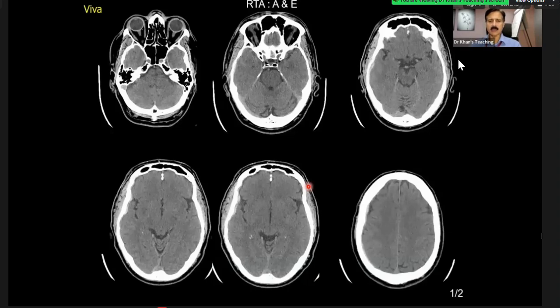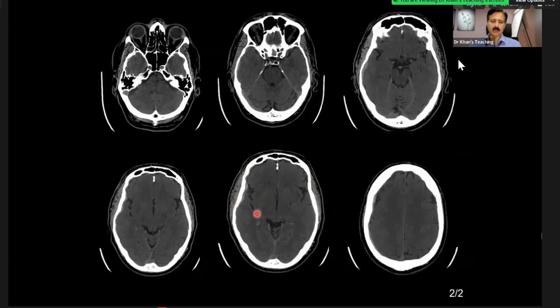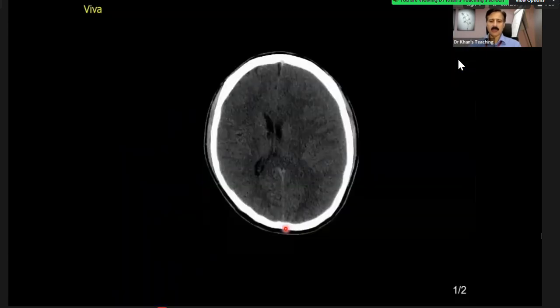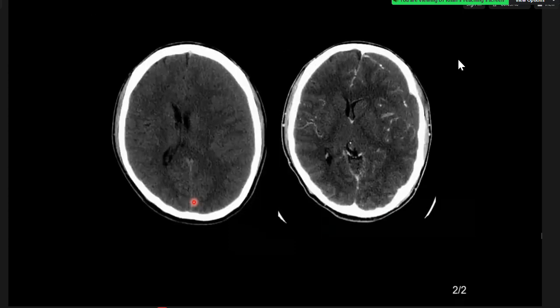Any hematoma here? Yeah, again in the middle cranial fossa, I can see a right-sided fine subdural. And do you agree that it is better visible? Yeah. Okay. Any hematoma? I think there is a hematoma along the left convexity, it might be because they're so isointense and there's no midline shift. Could it be bilateral isodense hematomas? But there's definitely something along the left convexity I can mildly appreciate.